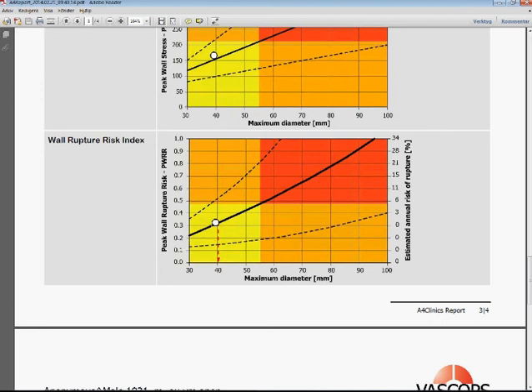That means this is a very typical average aneurysm. That's the reason why the rupture risk equivalent diameter is almost exactly the same than the geometrical diameter. But of course, as you have seen before, we might also have this point up there. And if we hypothetically would change this case into a female, then of course this point would go up there simply because females at the same size are at higher risk.